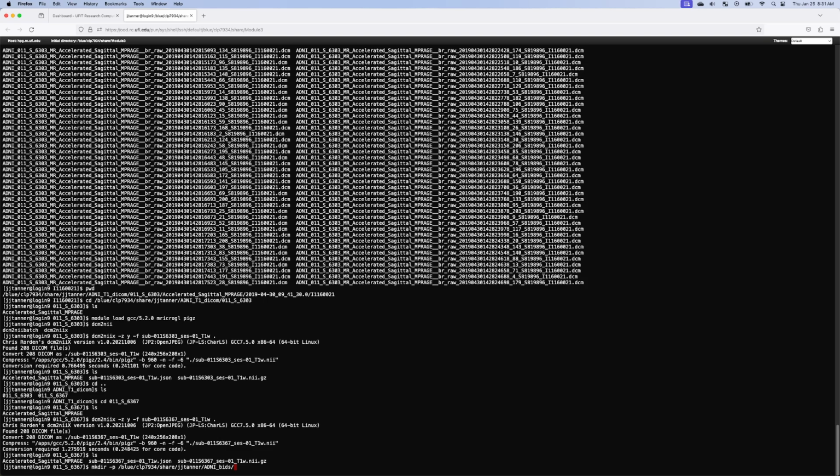What we want is within this BIDS folder, we want a directory for each participant. We just have 2 participants. So who are our 2 participants? We have the 63, 67. So I copy that. I double clicked on the ID, or you can just type it out.